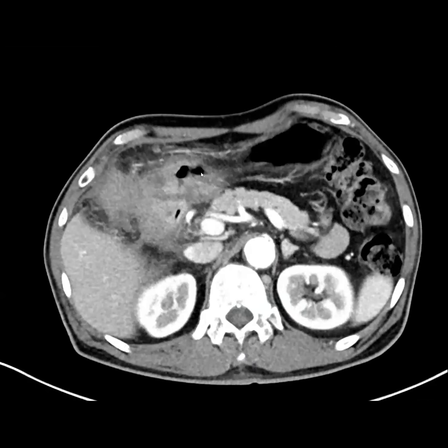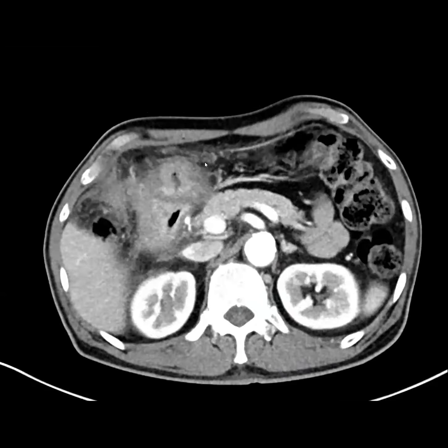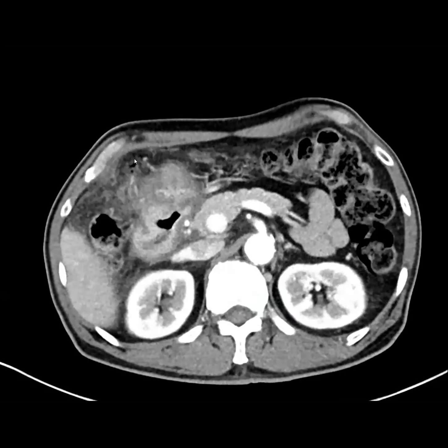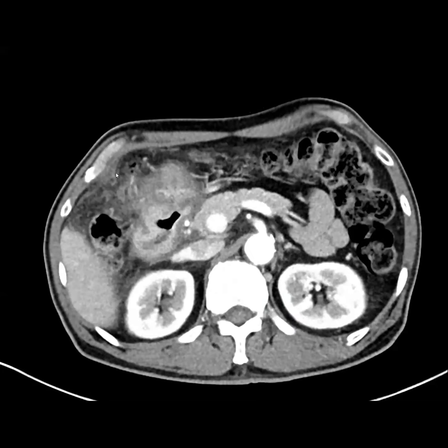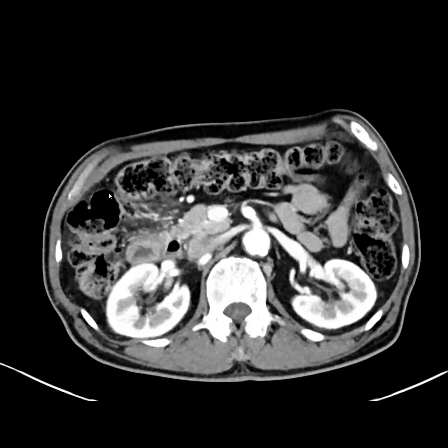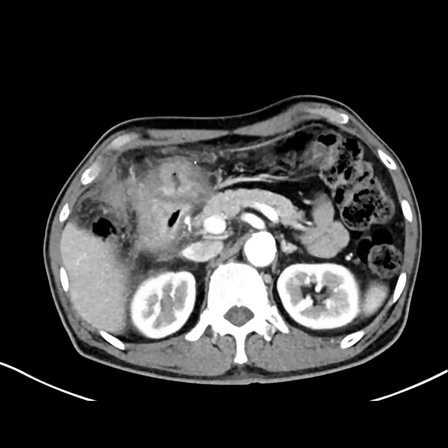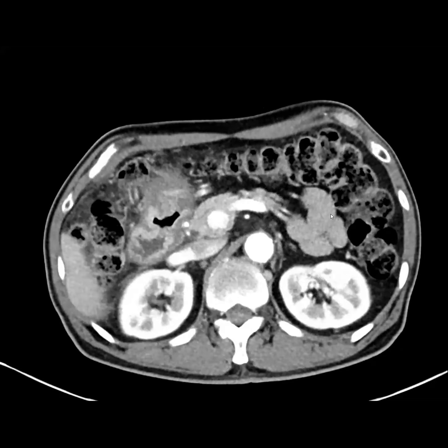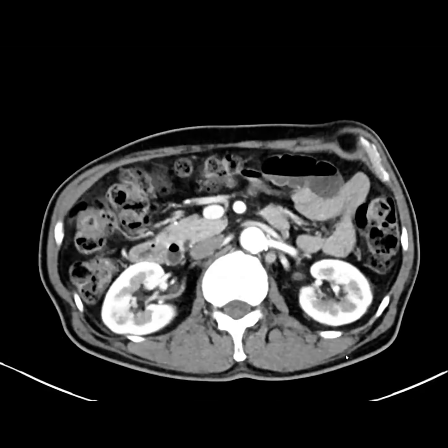additional findings, like these nodules here in the omentum. These would still probably be considered local. It's kind of like if you have a gastric cancer and you have nodules or nodes nearby, is it actual peritoneal disease or more localized spread? My surgeons have told me they hedge towards, okay, we'll see if this is localized, but we'll do a diagnostic laparoscopy and see if there's peritoneal disease elsewhere, which we didn't see.